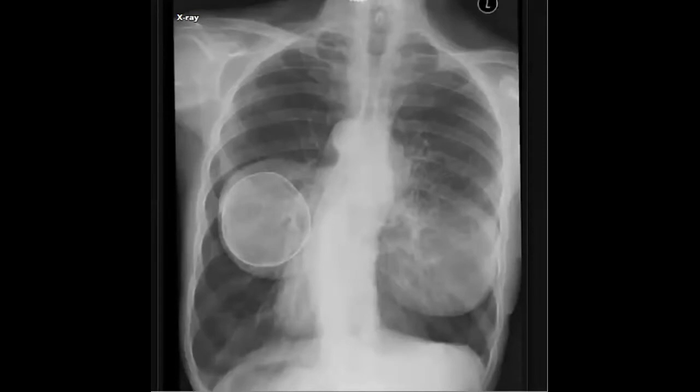So this patient, as you see, has this left lung opacity. And maybe you can see that there is associated interstitial thickening here, if you could note it. So there is a left lung midzonal paramediastinal lesion and there is thickening here, so what do you think about this?